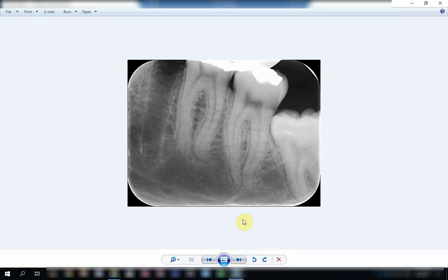The mental foramen differs in its shape. Mostly it is rounded, and in other cases you will find it as rhomboid, or sometimes it's simply an irregular foramen. Either way, the position of the mental foramen, sometimes being in close proximity to the root, is sometimes misinterpreted as a radicular pathology in relation to either the lower first or the lower second premolar.